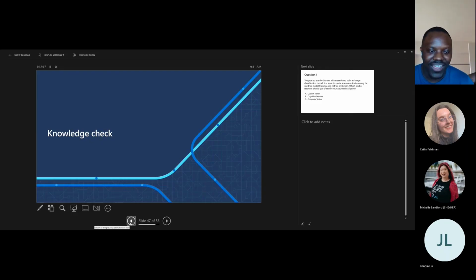And so really, that is what I wanted to demonstrate in terms of using Custom Vision with a data set to create a model and evaluate that model, and then being able to link that to Power Apps and test the model from within Power Apps without even having to access the Custom Vision website. And so this can be very useful.